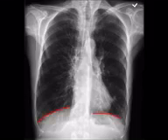Going through our system shows that there are flattened hemidiaphragms on both sides with blunted costophrenic angles. And you can also see some small areas of increased opacity in the hilar. The hyperinflated lungs and flattened diaphragm are characteristic of COPD. The blunted costophrenic angles are a little bit of a red herring. They're actually the result of the flattened diaphragm. The areas of opacity in the hilar are likely due to calcification of pulmonary blood vessels, so I would strongly suspect that this patient was a heavy smoker. Smoking is bad for you, of course, and this is what happens, so the lesson is don't smoke.